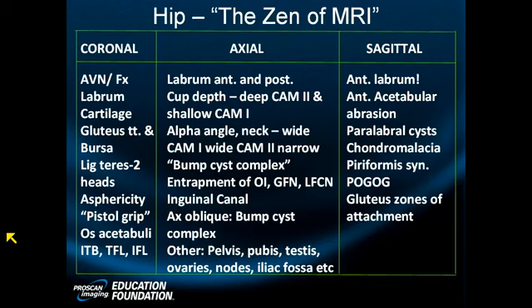A few other brief comments. Don't forget to look at the ligamentum teres. This is a common cause of hip pain. It's not a serious form of hip pain, but over time it becomes serious as the microinstability proceeds and the hip starts to float out and abut up against the labrum. So loss of the ligamentum teres may be a source of instability leading to labral tears.